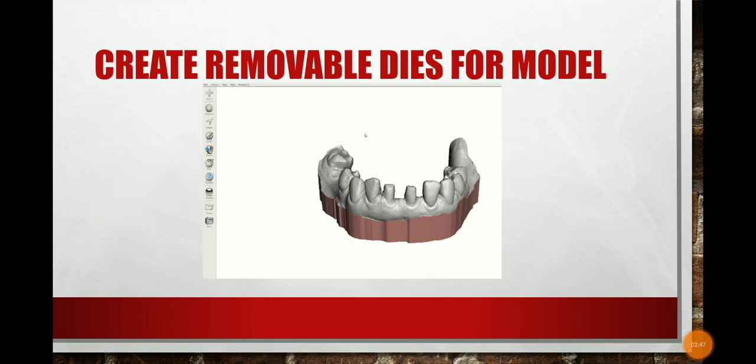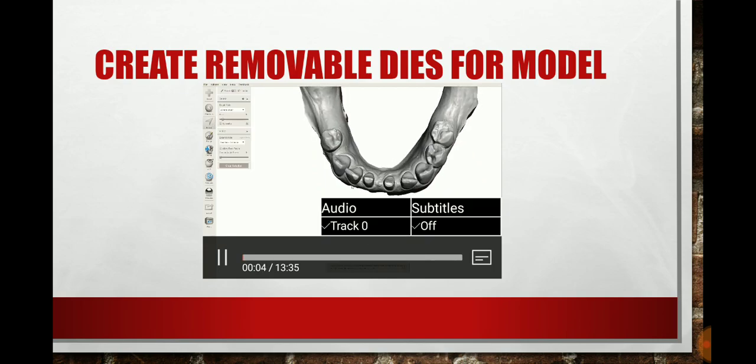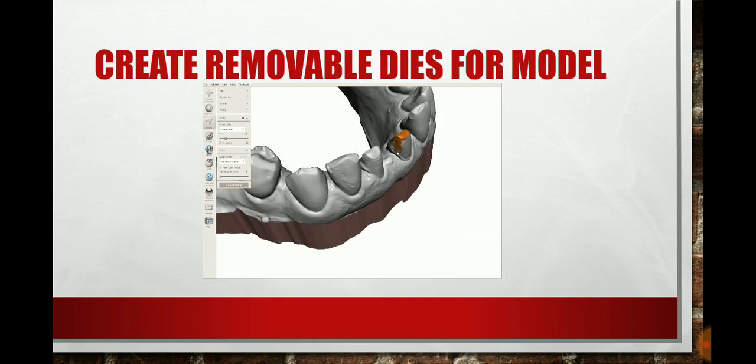So right now I want you guys to take a look. Hopefully we can get this thing started. This is a little video that we have, and I'm sorry that this won't go any bigger on this one, but this will kind of give you a step-by-step of what I just did.